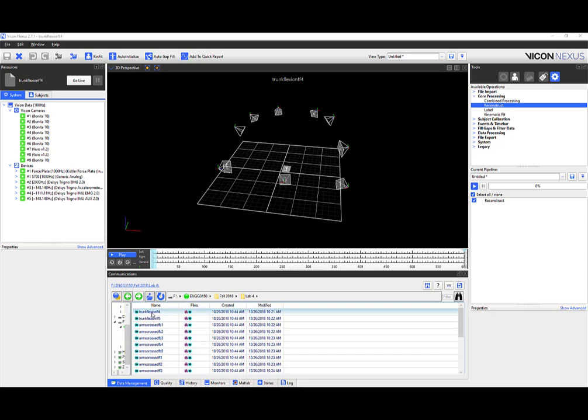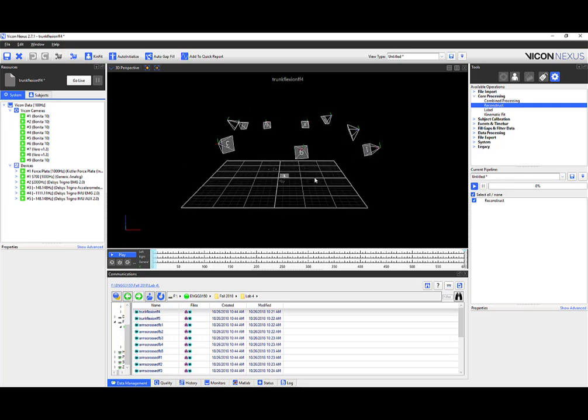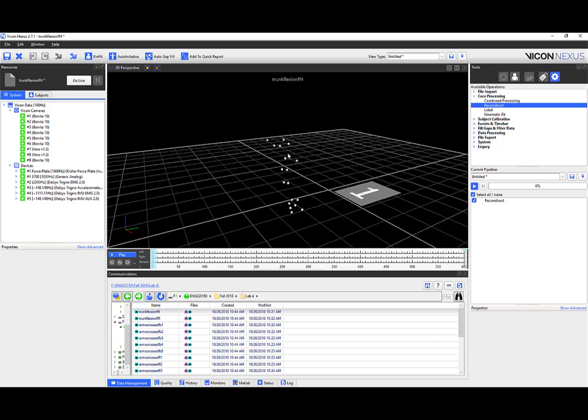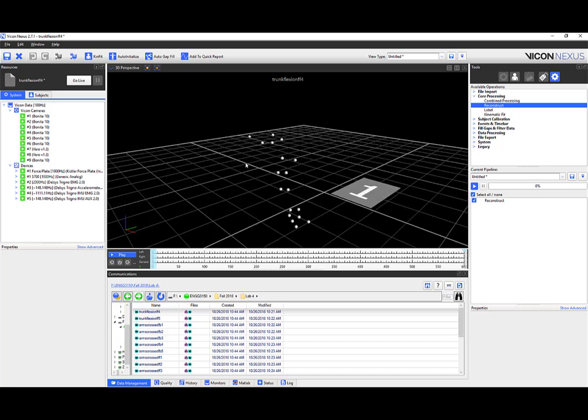The first thing you want to do when you double click is you want to hit this button right here, Reconstruct Pipeline. I'm not sure why it's not showing, but it's called Reconstruct. Pipeline ended. So over here we have our motion trial, right? And if you've collected EMGs, which we have in this particular trial, you can see the data of the devices you've connected and collected through on the left tab here under devices.